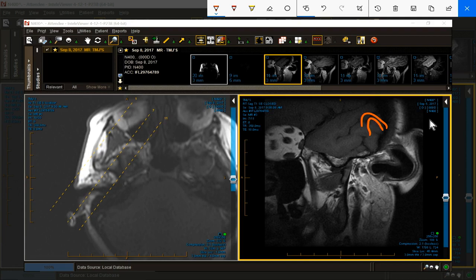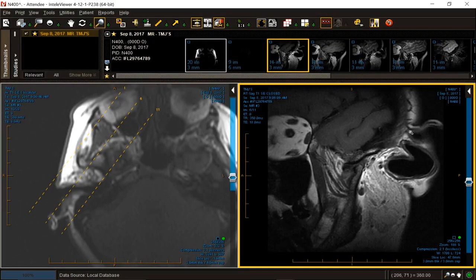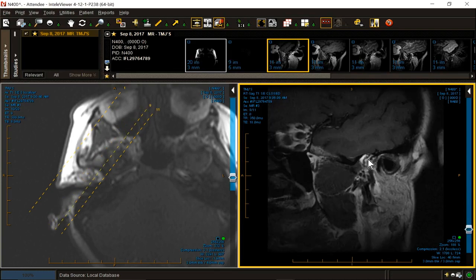How about the meniscus? Here's our meniscus right there. The back of the meniscus should sit 12 o'clock relative to the condyle or a little behind it. It does not. It's forward. It's almost 90 degrees forward, which would make this an American Dental Association criteria high grade, class 3 or 4. Where are the attachments? I don't see them yet.